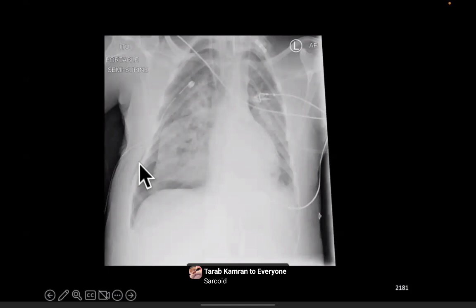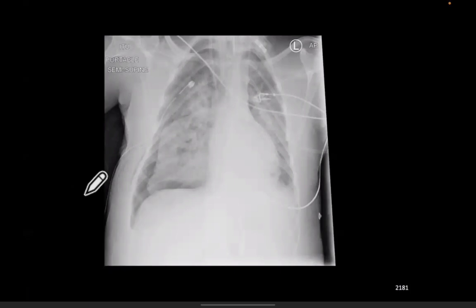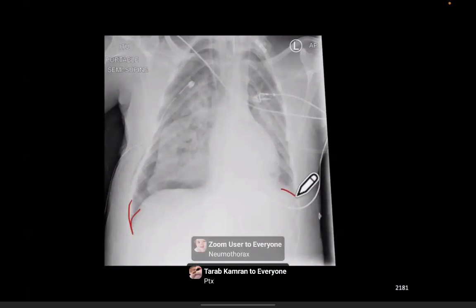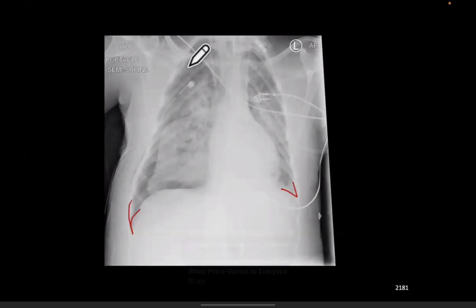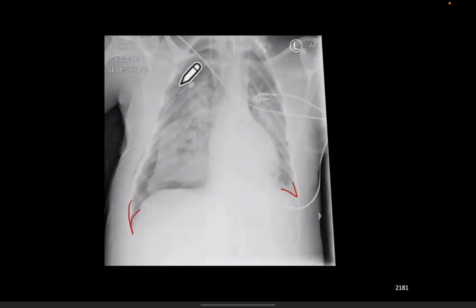Okay, patient with ARDS, they've got a deep sulcus sign. Compared to this side here, but you can see the lung edge anyway, so there is definitely a pneumothorax. There's a chest drain draining that pneumothorax. We've got ARDS, so the lungs are stiff. There's an ET tube in situ.